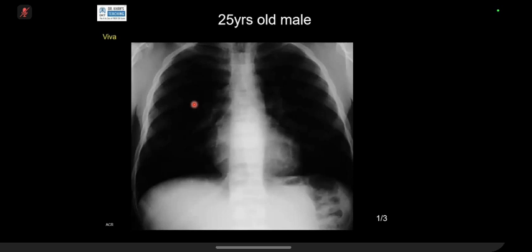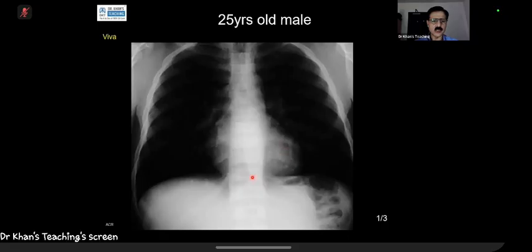This is maybe sickle cell anemia, one of the most important diagnoses. Thank you. So what is happening here is that on this AP view, I am showing you an X-ray which is very penetrated, a bone type of exposure, so you can see it very well. In the exam it will not be like this, and there will be more subtle findings.